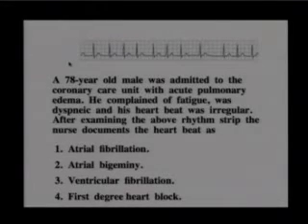We can rule out first-degree heart block. With first-degree heart block, you have a prolonged PR interval, and we don't even see P waves in this one. So the correct answer here is number 1. With atrial fibrillation, there are no identifiable P waves, and I just can't see them. There are QRSs and T waves, but no identifiable P waves. And usually we said with atrial fibrillation, the ventricular beat is apt to be irregular, and that one certainly is.